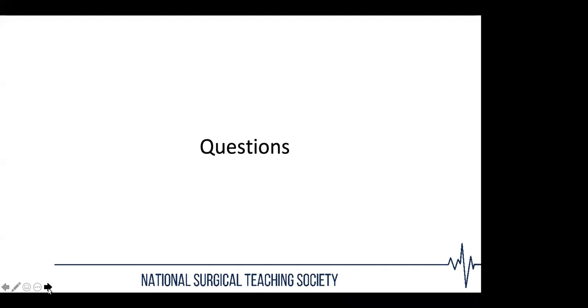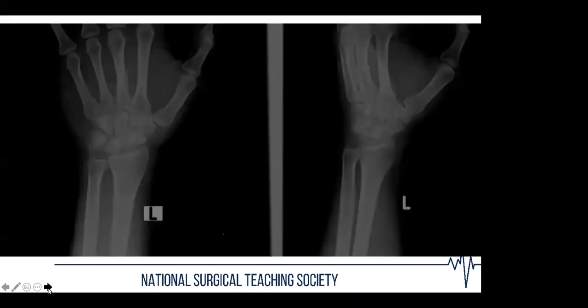I think the best way is if you guys write comments on the chat, and then we'll just discuss things from there. I hope some of these images project well. If they don't, worry not, I'll just talk you through them afterwards. So this is our first case. If you guys just put on the chat what you think of the images.